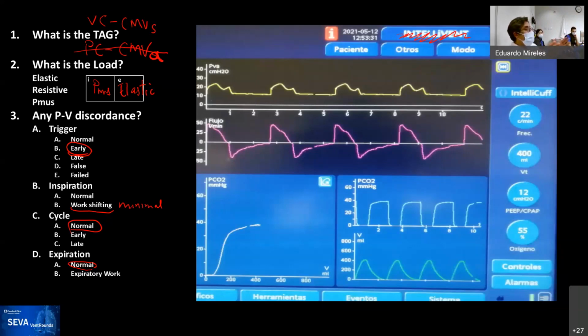Okay. So if there are changes in the compliance of the tubing on the flow, even though the ventilator just gave that flow, your pressure is going to drop. You're going to see some amount of increase in the flow that you see on the waveform. And actually, if you go out and see our ventilators that are in volume control, you're going to see that.